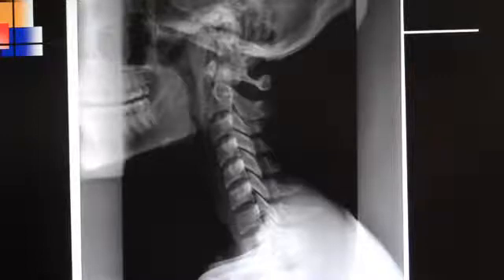All right, as we move forward, we go down to the next segment. If we get down to C3, we have, of course, the vertebral body here. And this density that is superimposing the body right here is the transverse process. The density that is sitting on top of the body is called the uncinate process. This section right here would be called the articular pillar. The whole thing is the articular pillar.